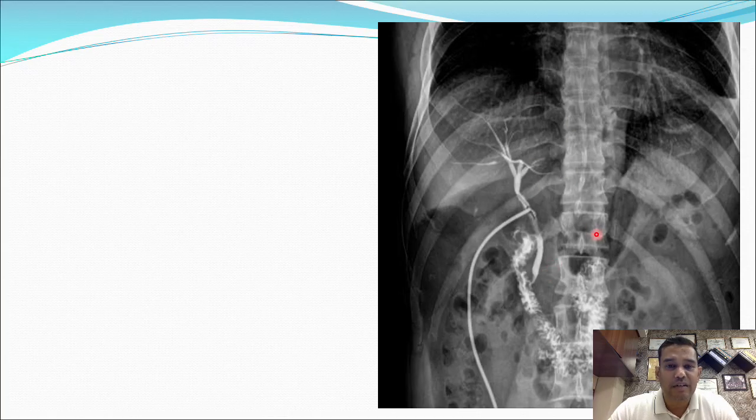Now, one important peculiarity I could appreciate is that it is giving me a tree-like pattern. You could see the branches. This is the stump of the tree, and you have a branching pattern, and it is present over the right side of the upper abdomen of the patient. So what is the structure that forms a tree-like pattern on the right upper abdomen? It is the biliary tree.